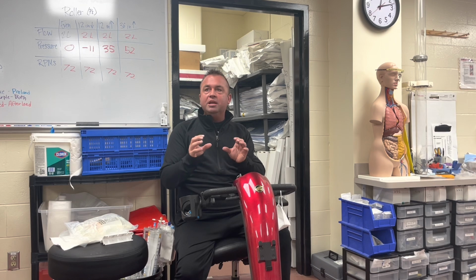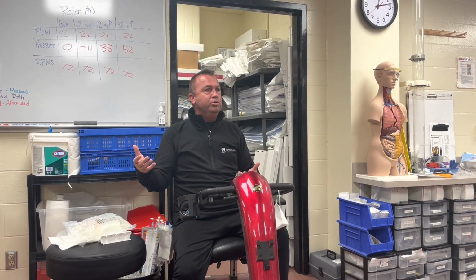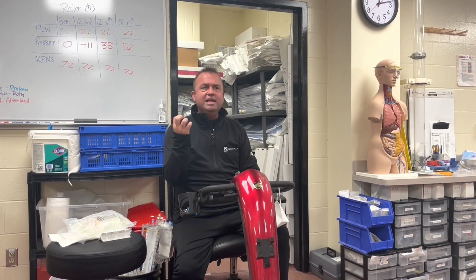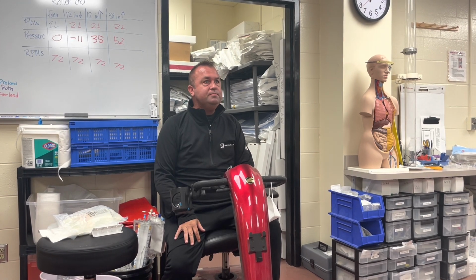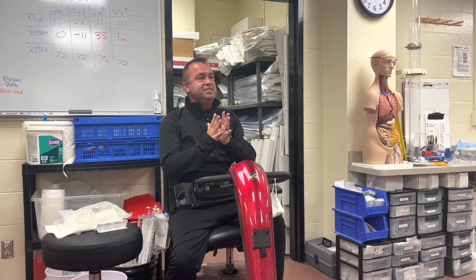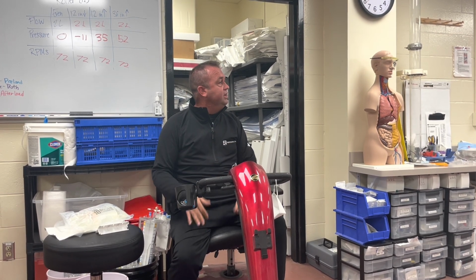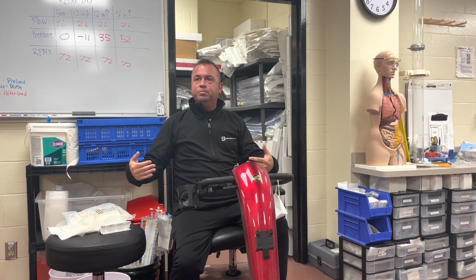We'll compare that mean, and we'll find that mean off the central aorta is probably 10 to 15 points minimum higher than what that radial pressure will be, just because that vessel is so much bigger and gives us such a better pressure. Does that make sense? Given though also that the elasticity of our tubing does dampen that pressure a little bit, it will still be higher and better. So that's a little bit of an idea of how we measure pressure.